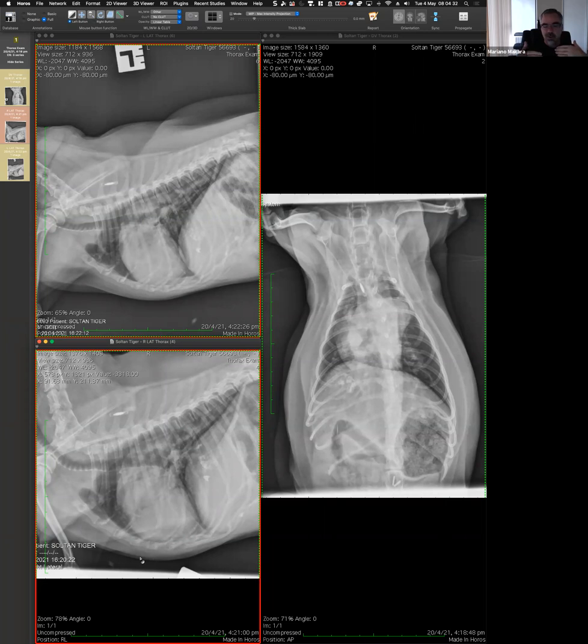Makes sense? So probably I would not ask first for the clinical signs. I would take a look at the images first, knowing that I'm going to be limited, and knowing that if I add the clinical signs and the history and everything to that, I may completely change my mind. So I'm not going to stick with what I said, but I prefer to have that impression first and take note.